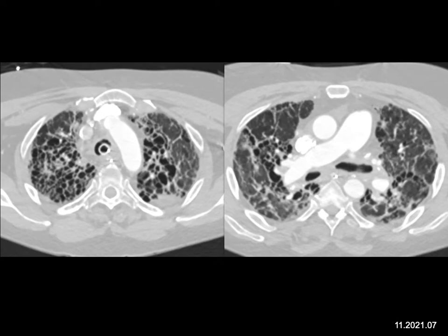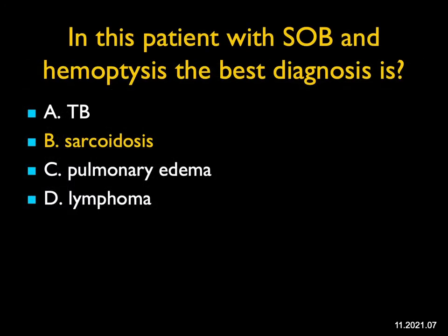It's not simply pulmonary edema, right? It's not the appearance of pulmonary edema, and it's not the appearance of malignancy, though the patient does have some nodes present. One of the diseases that gives you nodes and bad lung disease, particularly in the apices, cystic spaces with fibrosis, is sarcoidosis. If you had the coronal views here, you would have seen the pulmonary arteries pulled up to the apices due to the fibrosis, and this was a great case of end-stage sarcoidosis.